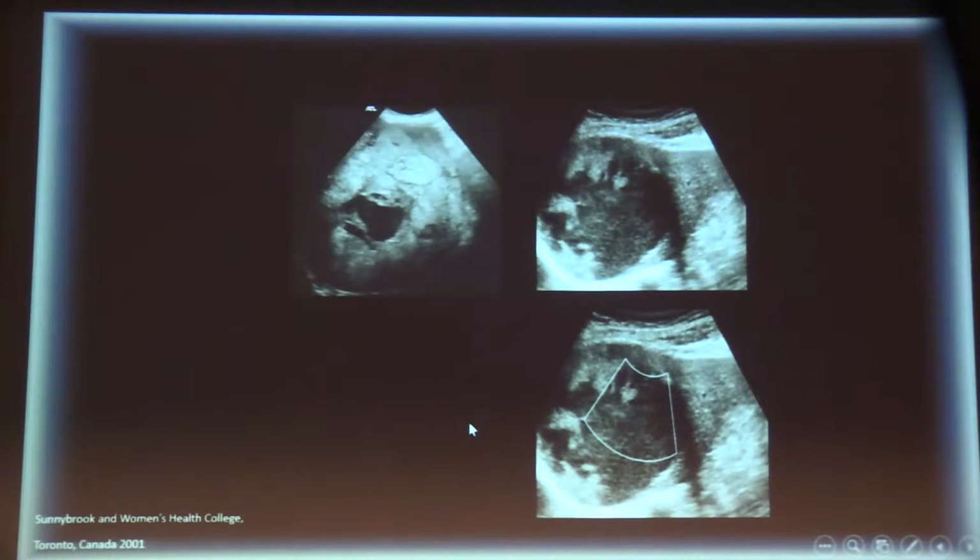However, look at this patient. This patient came in with right upper quadrant pain, with a mass in his liver and had a central cystic structure within it. Now, there could be a differential diagnosis for this. This could be a large hemangioma with a necrotic central area. This could be a large hematoma with some liquefaction within it. This could be a necrotic tumor. This could even be, in the right clinical setup, an abscess.